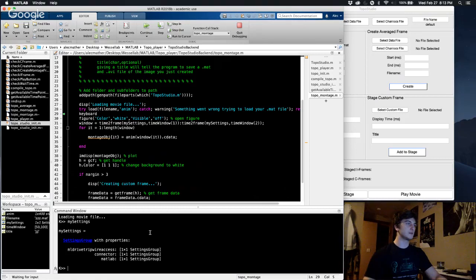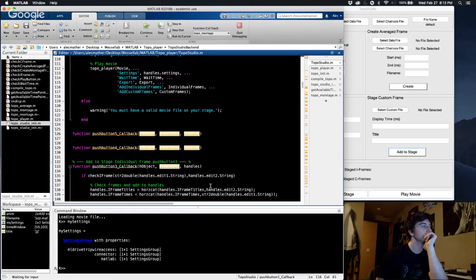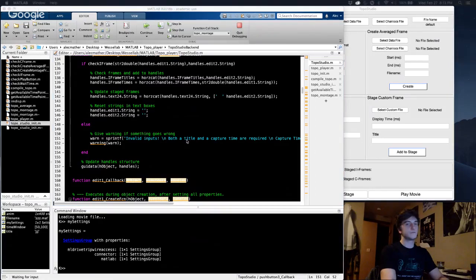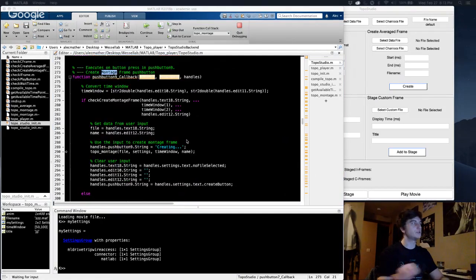That doesn't make any sense. Oh, wait. This is montage.